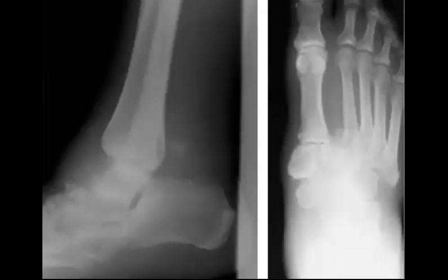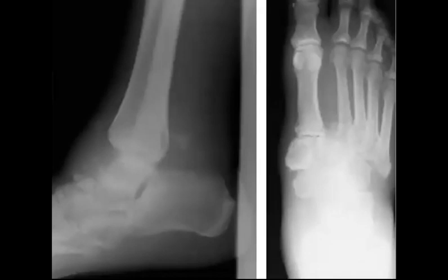So sometimes it has what is called talocalcaneal fragmentation between the talus and the calcaneus. There is much fragmentation happening. So all this gives you the impression of Charcot. You know that, is it the midfoot? Yeah, this is the midfoot. So neuropathy starts with subluxation in the midfoot.